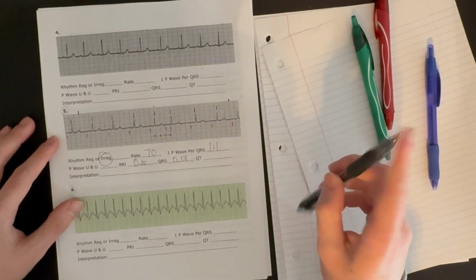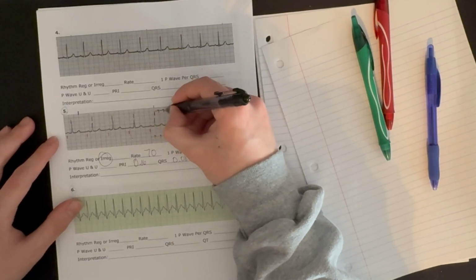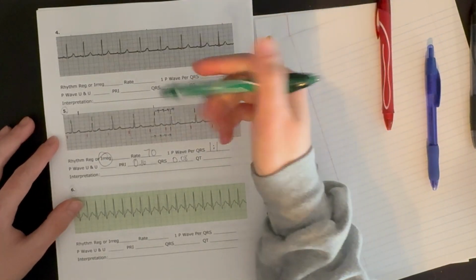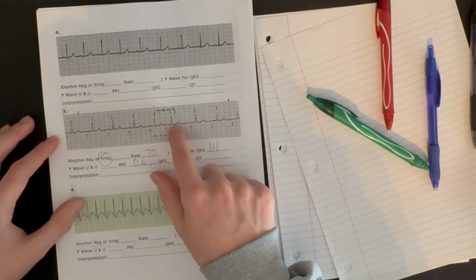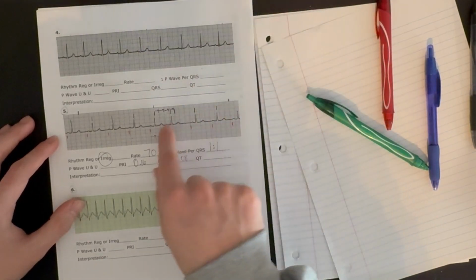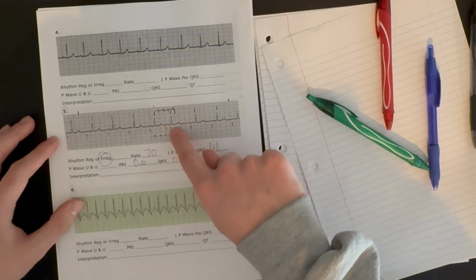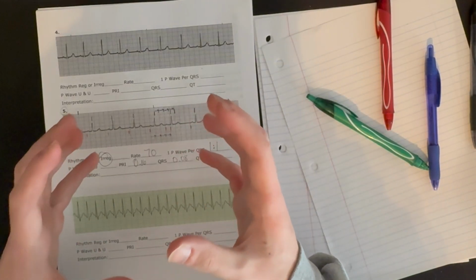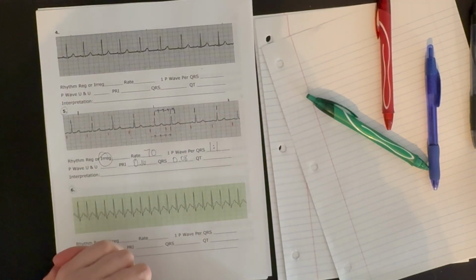And we can look at the QRS complexes. It also should be about 4 in between each one. If this beat right here was on time with the rest of the beats in this rhythm, our P wave would be at this second red line, our QRS would be at this second green line. So we know that we have a premature heartbeat, okay? Now we have to determine, where is it coming from?